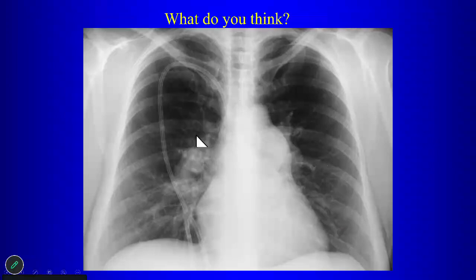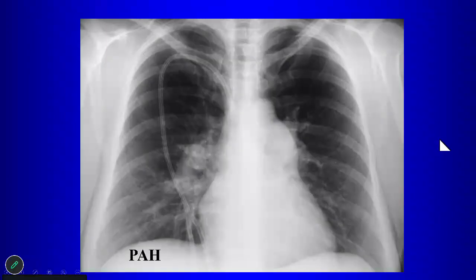Pulmonary artery. So the main pulmonary artery here, right? So here's the aorta, here's the main pulmonary artery, is left atrial appendage. So that is really big. And what do you notice about the size of the right pulmonary artery? It's also enlarged. Left pulmonary artery also appears enlarged. So we have enlargement of central pulmonary arteries. What are we going to be concerned about here? Yeah, so here you're going to be concerned about pulmonary artery hypertension with enlargement of the central pulmonary arteries.